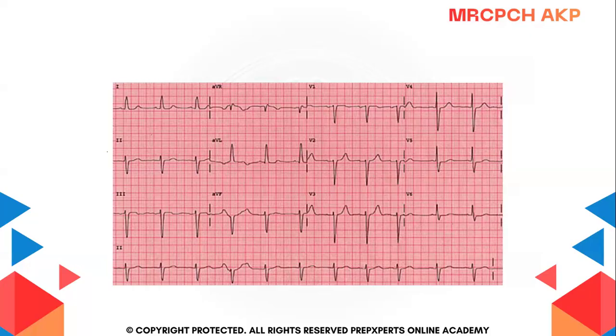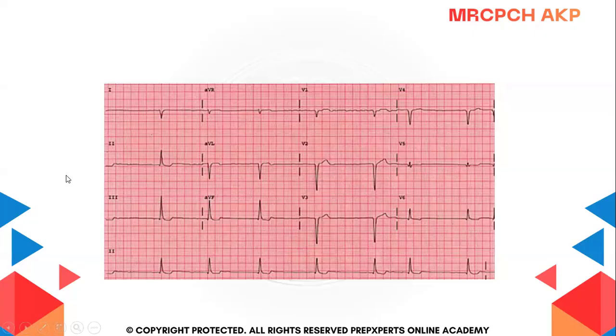Okay, so here, lead one is my left thumb. So it is up, very nice. And lead AVF is my right thumb, which is going down. So again, it's a left axis deviation. Very good. Let's move to the next ECG. Okay, which axis is this one? Right axis. Good. So it's not that difficult.